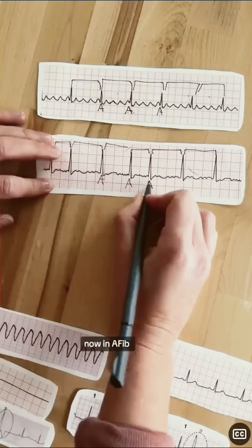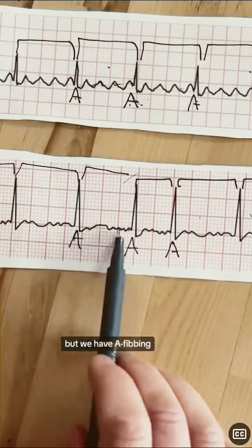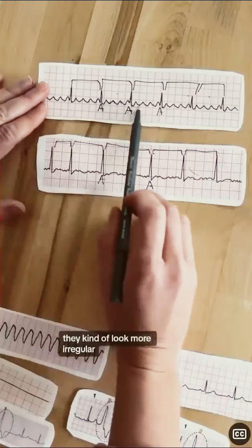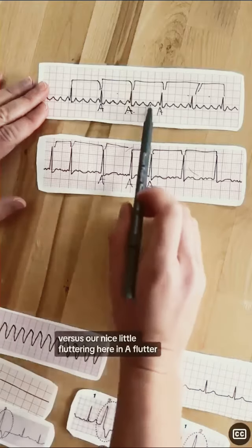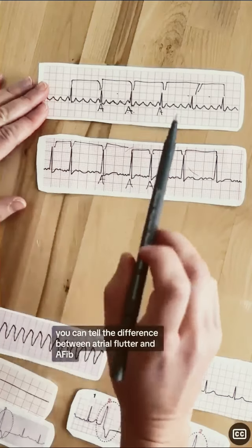Now, in AFib, these do look like A's as well, but we have A, fibbing, fibbing, fibbing, A, fibbing, fibbing, fibbing. They kind of look more irregular versus our nice little fluttering here in atrial flutter. So now hopefully you can tell the difference between atrial flutter and AFib.